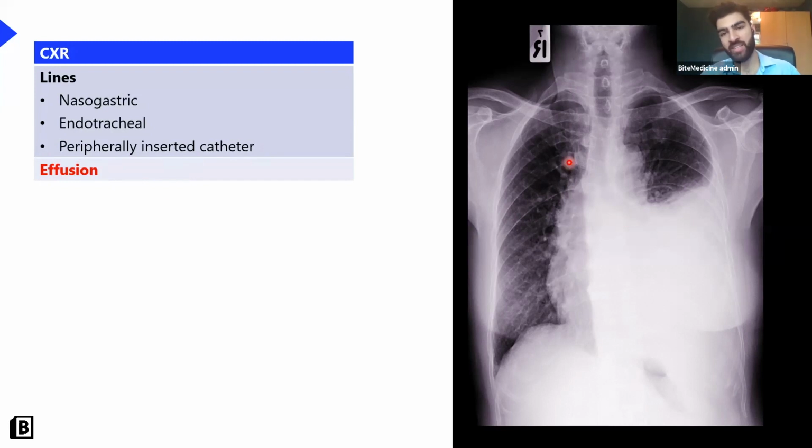Well, this is the amazing thing about chest X-rays, is that you can compare one side to the other. Nice, sharp costophrenic angle, nice, sharp hemidiaphragm, nice, sharp heart border. Look at this side, lost the heart border, lost the hemidiaphragm, no sharp costophrenic angle, and we've got a meniscus.